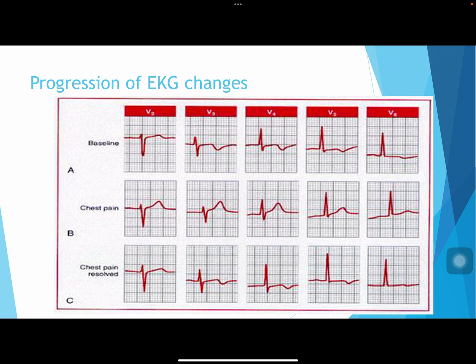So which ones would you consider abnormal for a stress test? Hopefully you said 1 and 3. Those are the two that are suggestive of CAD. If you had the second one, not so much. But those two on the ends are the ones we look for within a stress test, or changes that may happen. Those are the changes you definitely need to get a doctor to peek at.